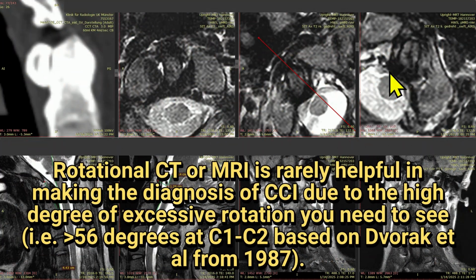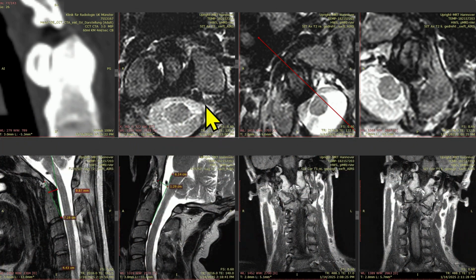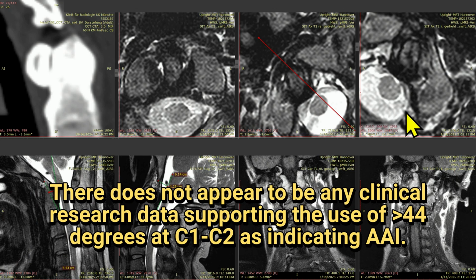And then we have these rotational images, which are common in Europe. The problem with rotational images is that you need to see greater than 56 degrees of C1, C2 rotation based on Dvorak 1987 paper, but you rarely see that. And some surgeons will use 44 degrees. That doesn't appear to be scientific or science-based in anything that compares normals to controls. So these are rarely useful, but here they might be useful. They're rarely useful for looking at too much C1, C2 rotation.